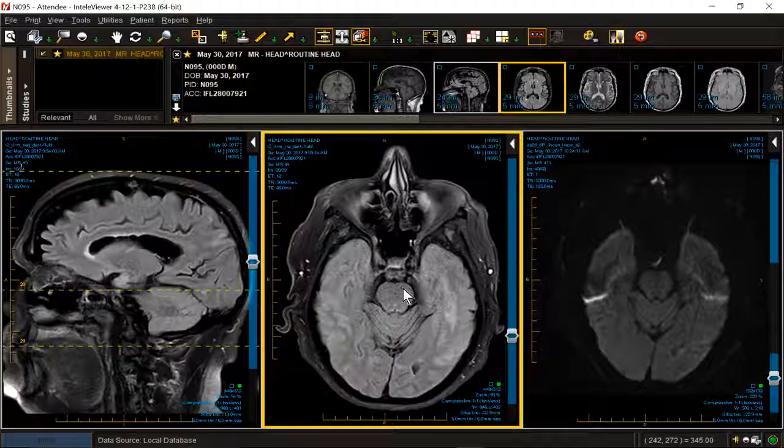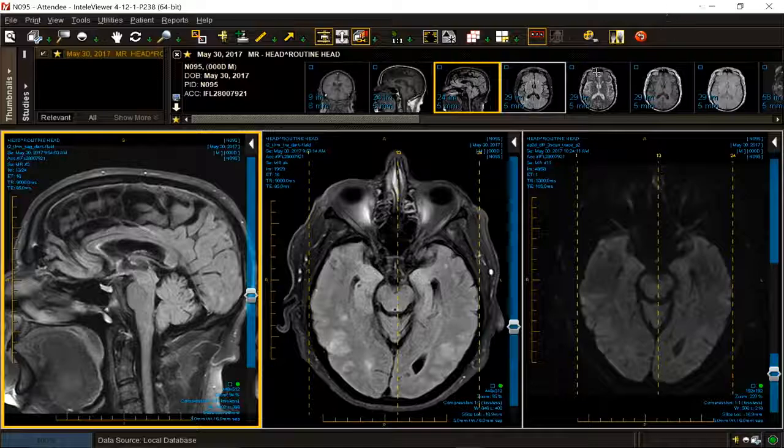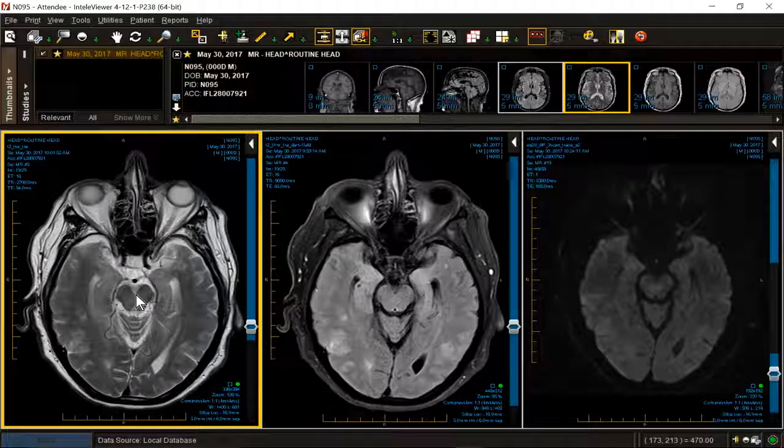Some of them will produce extension into the occipital region, like top of the basilar syndrome, with emboli extending posteriorly. So that would be a consideration had we had an aneurysm. Let's put up the T2. We don't have an aneurysm. That's a normal appearance of the basilar artery.